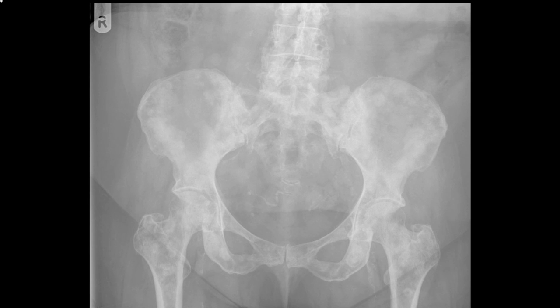Here is another patient who's been referred for pelvic pain. There had been no trauma. When looking at a pelvic radiograph, the other thing to consider is the bone density. After thinking about trauma and joint disease, as we've said, looking at the lower spine, bone density can give a key to more serious problems. This lady has areas of dense bone within what we take to be normal bone.